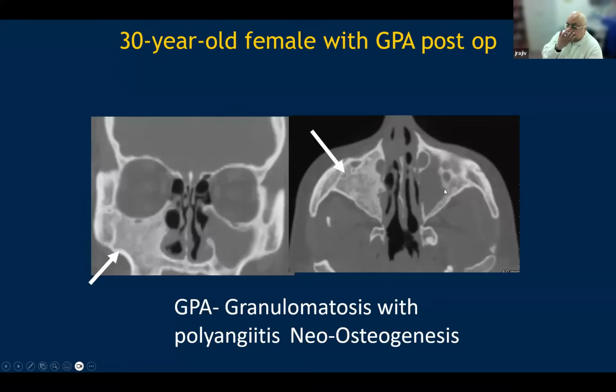And this is a very important aspect which you need to stress on while you're looking at the maxillary sinus, which has already been operated upon, especially this. But it can occur in several other areas, especially in the frontoethmoidal recess, because of the chronic mucositis and the scarring that takes place following the debridement of the anterior ethmoid air cells.